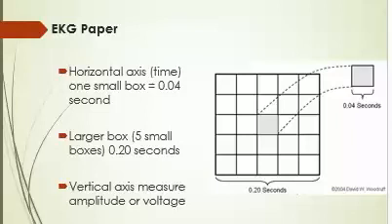So there it is. When we look at our vertical axis, remember I was talking about the ST segment, and we looked at that for depression or elevation to decide if our patient has had some ischemia or an injury to the myocardium. So that is very important. We'll ask how many millimeters is it up or how many is it down to determine the degree of damage that has been done. So this will make a little bit more sense when we actually see our first rhythm, so you can look at these boxes. And I'm still clinically practicing, and those little boxes are there. There are lots of cute little tools that we use to look at them.